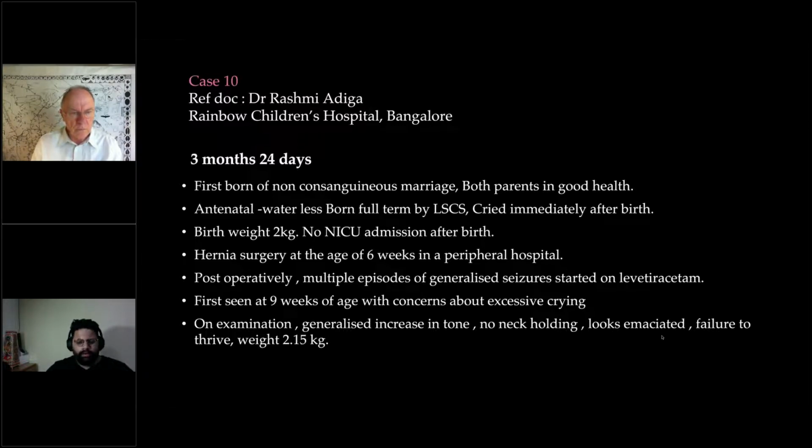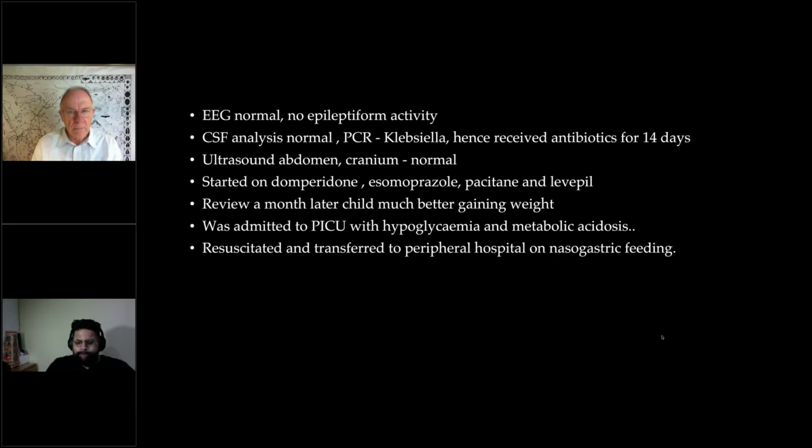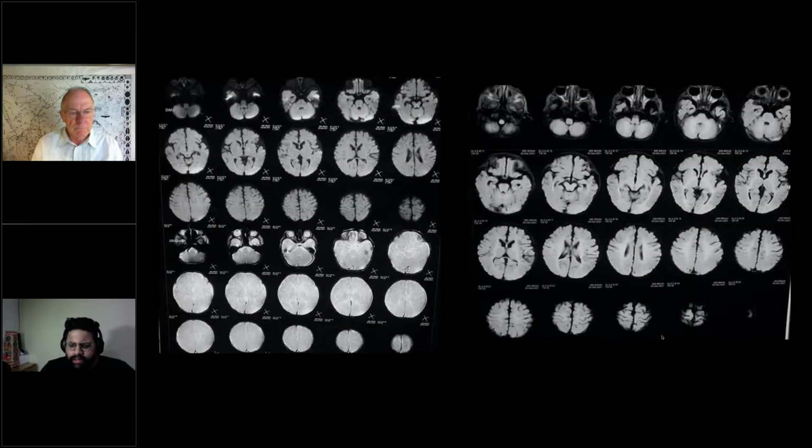Okay. We'll probably continue the discussion after the imaging. So the scan was done at 3 months of age, Dr. Rashmi? I've written. So the scan would probably have been done at 3 months and 15 days or something like that. Okay. So you have the diffusion on top. Cannot find any signal changes on diffusion. No areas of cytotoxic edema.